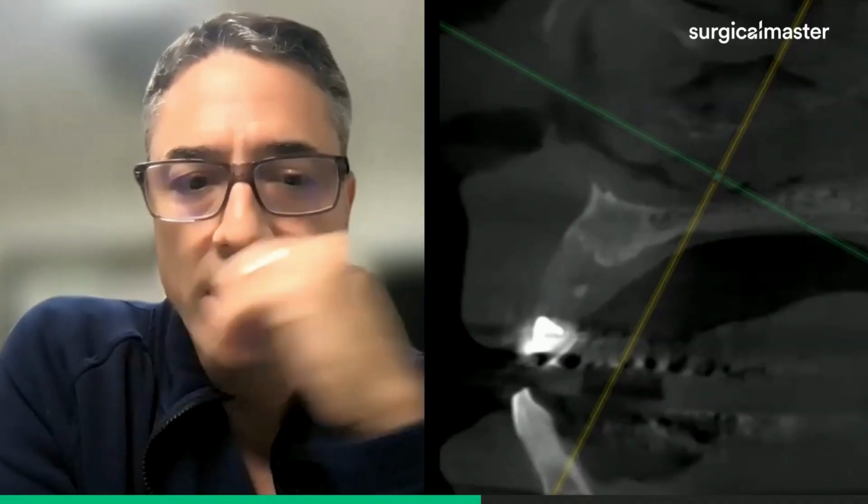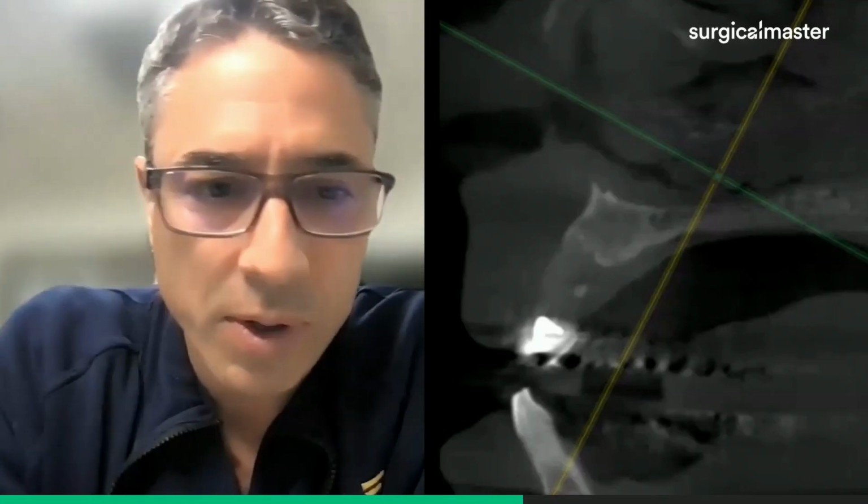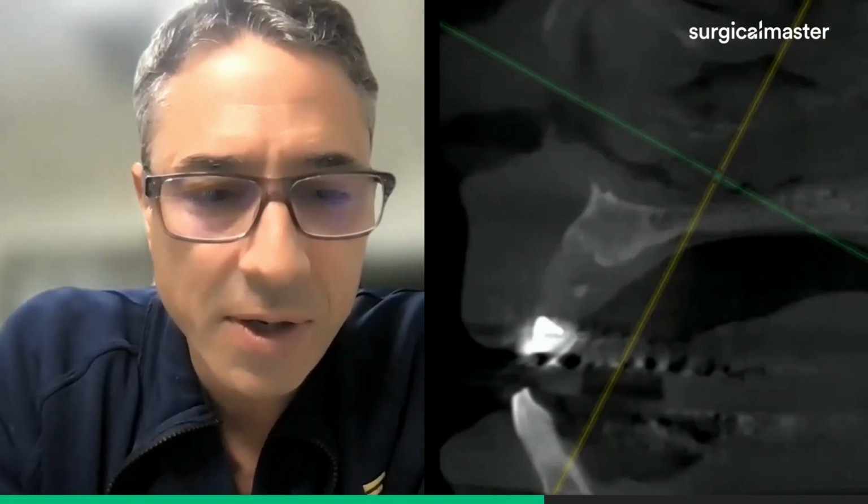So I think it's a great option. But let's look at that. Let's look at the soft tissue profile, so we can plan that procedure. Maybe we need to augment it, not for an implant, maybe for a pontic. So we have a nicer pontic and a better emergence for the fake tooth. That I think that's where we're at so far, because with these types of cases, I don't want to give half-baked advice without having all the facts in front of me.